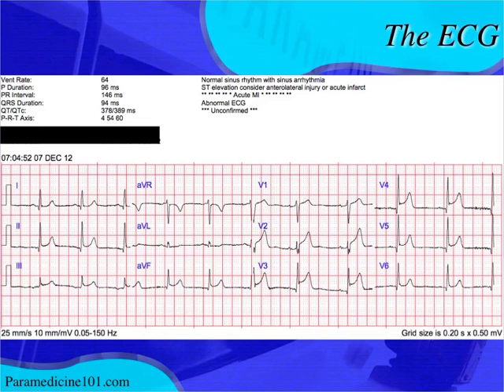All right, and all of the ST elevation is concave. So if you were to draw a line like I did there in V4 from the J point to the peak of the T wave, the ST segment falls below that line. That means it's concave, which is generally not as bad, but it can still be bad. So you have to look for other possibilities of an MI.